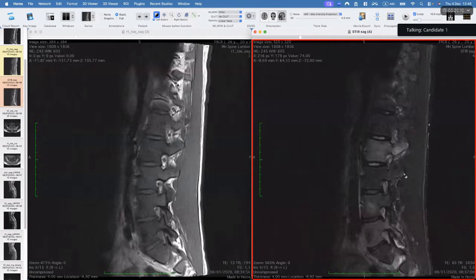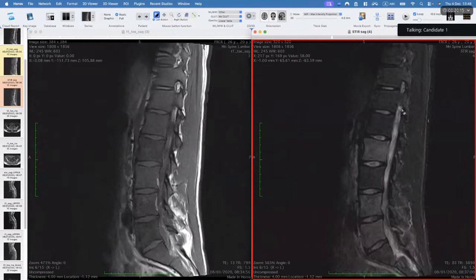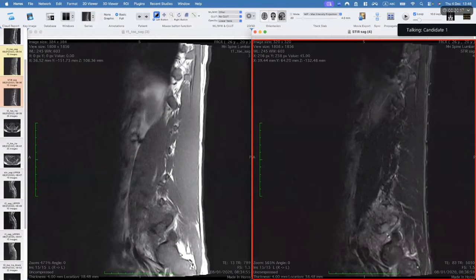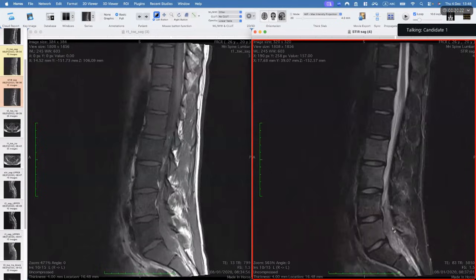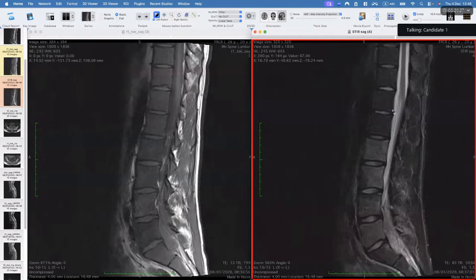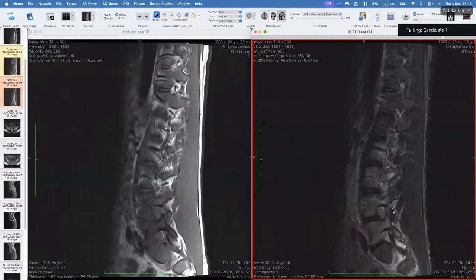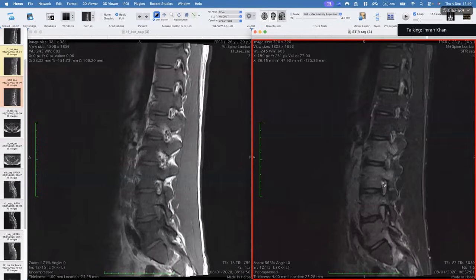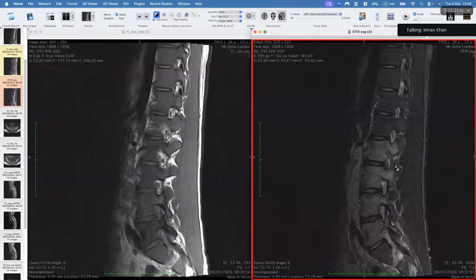Okay. So I'm looking again in the spinal canal. I can see that in the lumbar region it is also extending into the posterior elements, and there is no disc space narrowing again, and the conus is ending at its normal anatomical location. There is no stenosis. There is no disc protrusion. Ignore disc protrusions, ignore disc herniations, okay? This is just back pain.